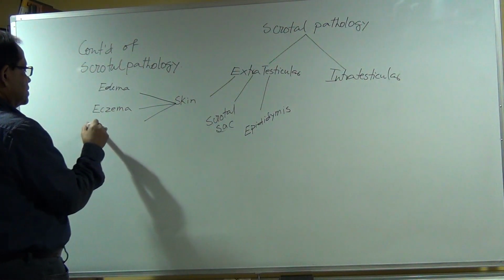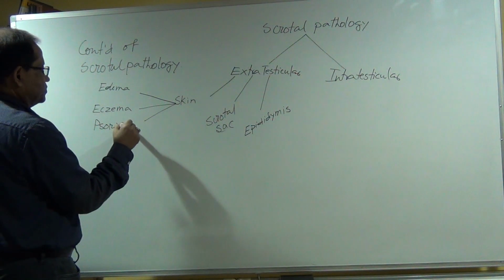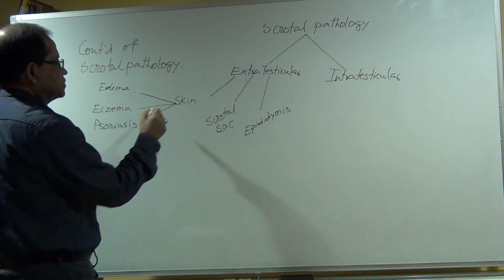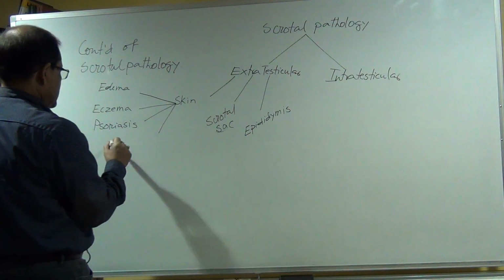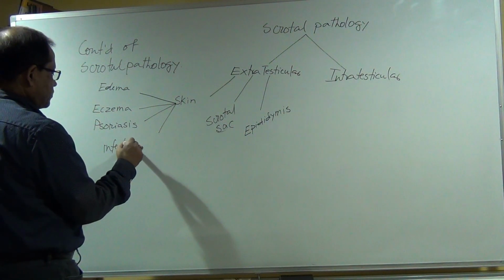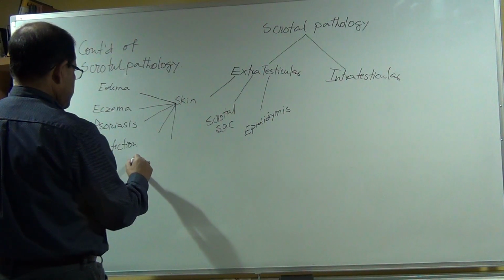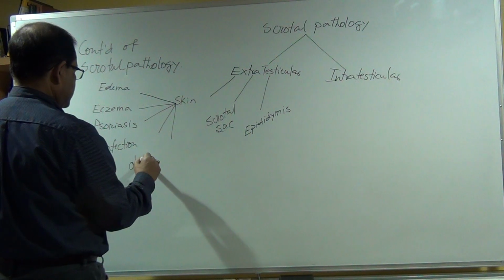What else? Psoriasis. What else? Infection. You can see abscess.